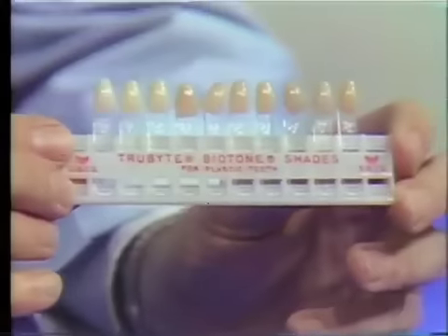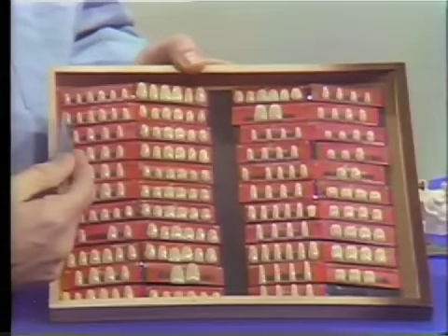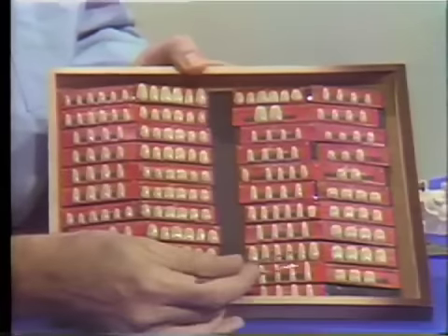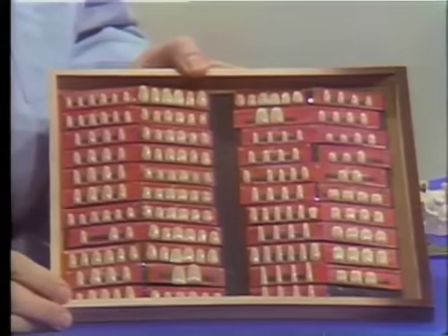If you're going to use one of the resin types of facing, then you use the biotone shade guide to select the particular facing. Whichever type of facing you're going to use, the mold is selected from the same mold guide. And here we have the mold guide for these Steele's Flatback teeth. They come in quite a reasonable range of maxillary anteriors here, molars here, mandibular anteriors, cuspids, and so on. So out of this, it's possible to select reasonably well a tooth that will match any particular case.